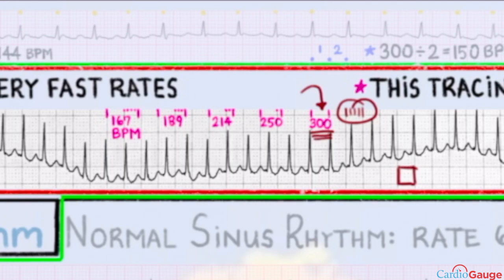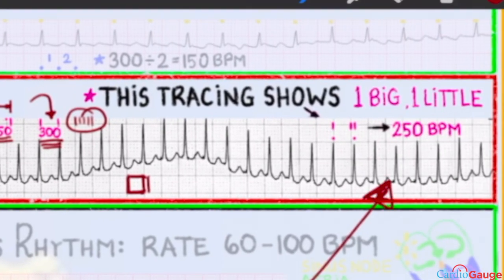If you have 6 little boxes, that would be one medium box plus one little box. That's what I'm showing here. This is 6 little boxes, then you've got a rate of 250 beats per minute. And then 7 little boxes, 214, 8, 189, and 9, 167 beats per minute. So looking at this example, it's about 6 little boxes between QRS complexes, and that means we're looking at a rate of 250 beats per minute on this one.